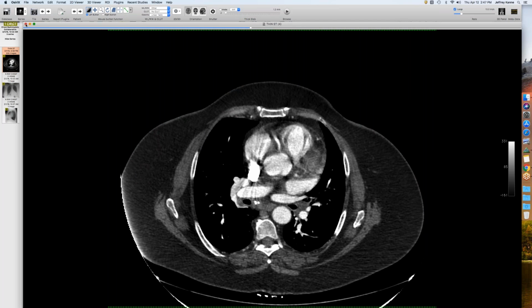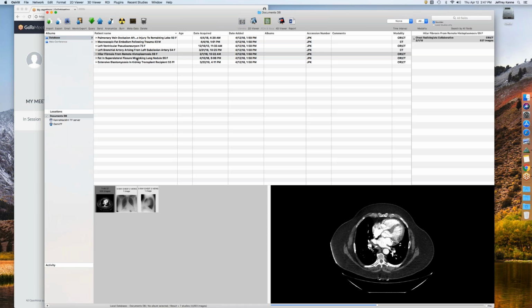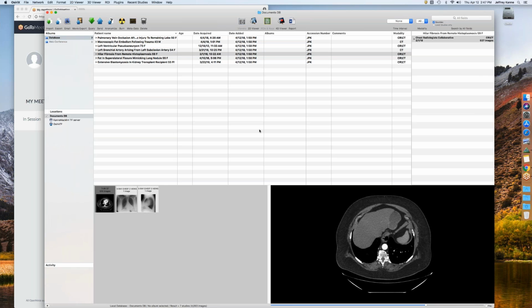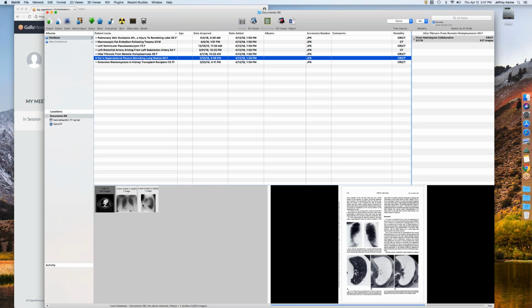I think I showed that one already. And was there anything in the spleen, Jeff? Oh yeah, you always ask me that. No, yes. There's so little TB here that it's still histo. You don't need disseminated histo to get fibrosis. So, okay, but you didn't see anything in that spleen there. It went by pretty fast for me.